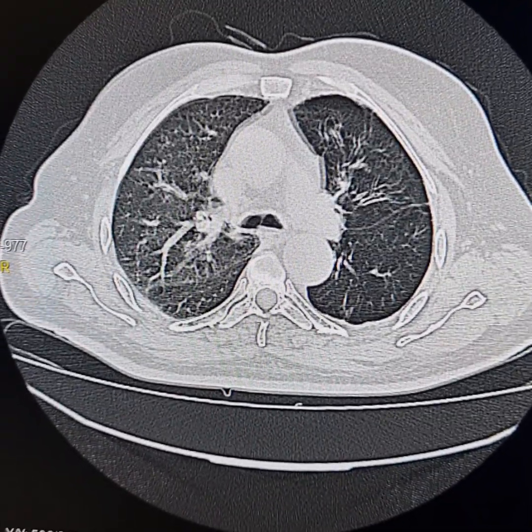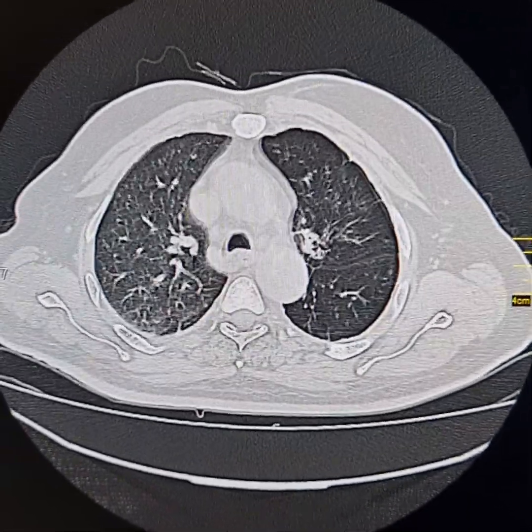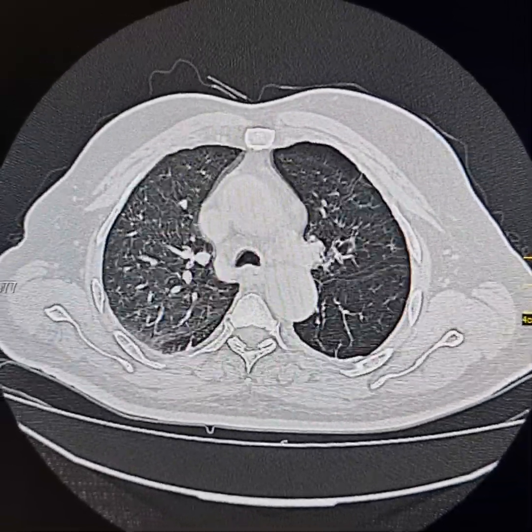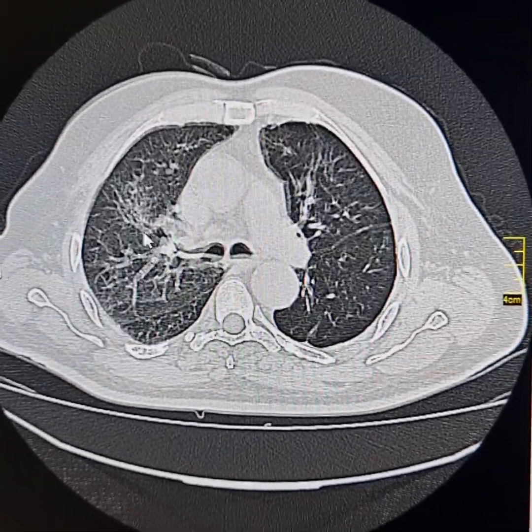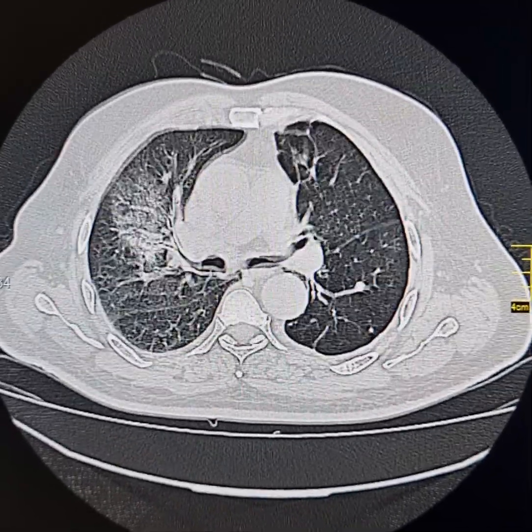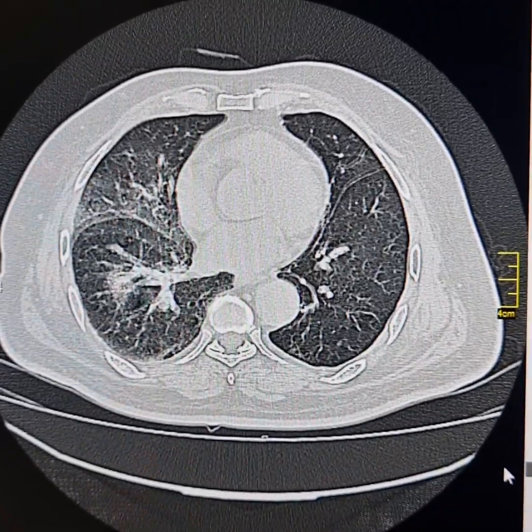Now please come on to the right side. Now just compare the differences between the sizes of the pulmonary arteries and perfusion on both the sides. These are the pneumonic consolidations. On the right side, pneumonic consolidation has involved the anterior and posterior segments of the right upper lobe, both segments of the right middle lobe and the apical segment of the right lower lobe.